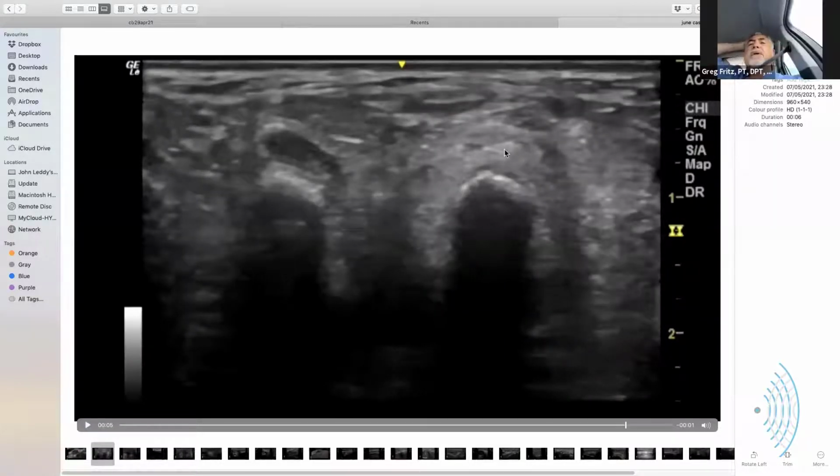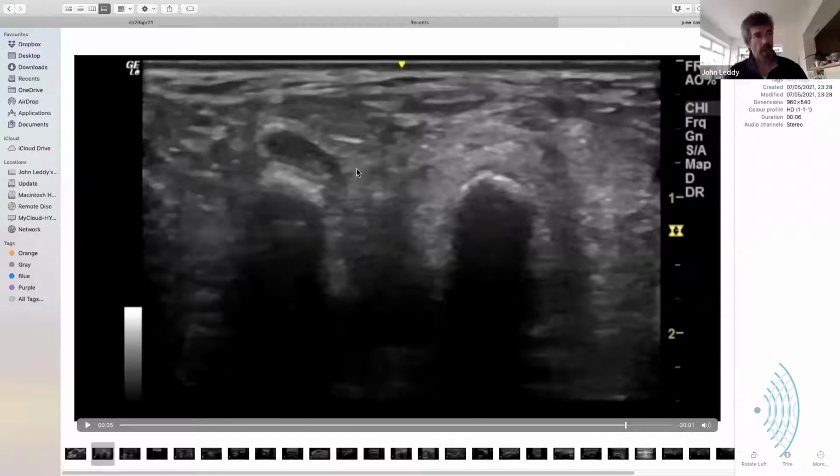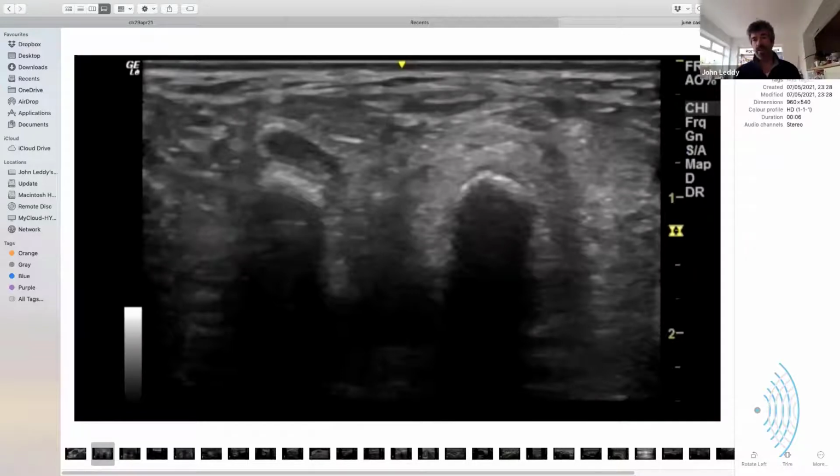Yes, that's bright. The tissue around the other next metatarsal is not. That's normal fat appearance and maybe some muscle there. This is bright, fatty, reactive tissue, which you don't typically see a lot of in just a typical inflammation of a joint. But if you have an infection, then you get this.